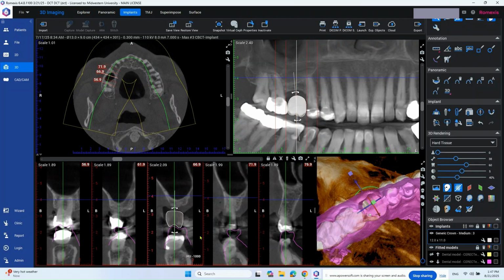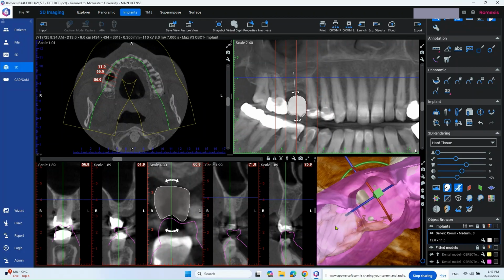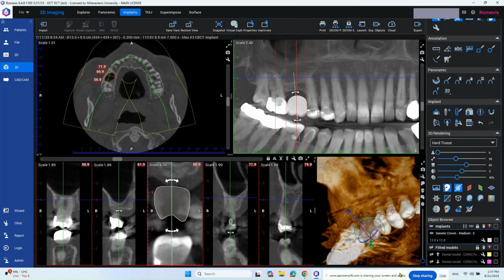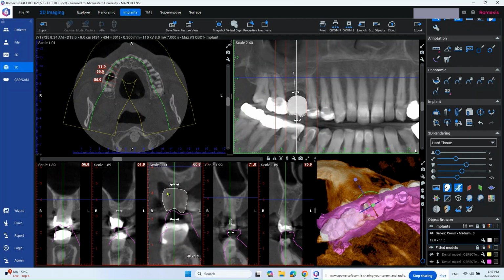And if I add the lower back in, now I can see where the occlusion is hitting. And you can see the occlusion coming through. But again, this isn't the definitive occlusion. Obviously, you have a slightly flatter tooth down here, and this is heavily anatomized. So again, not 100%. So you always want to verify in CEREC before you do this. So, okay, I'm just going to move this into place. And actually, it looks pretty good. We're going to go with that. I'll put the lower on just so we can see where it is.